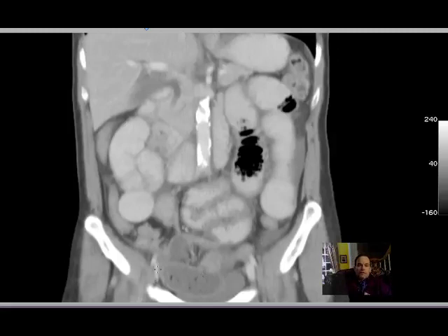If you have an obstruction, let's say in this area right here, one thing you'll see first is that contrast has not yet gotten there. So that tells you, let's see, is this distal? Is this near the obstruction? Well, you can clearly see that this is, because it doesn't have any of the oral contrast yet. So you can see oral contrast has progressed through bowel but has not yet gotten here.